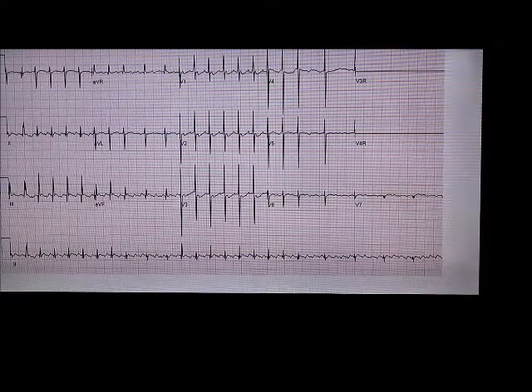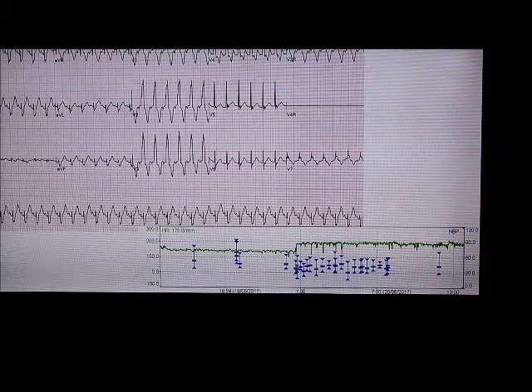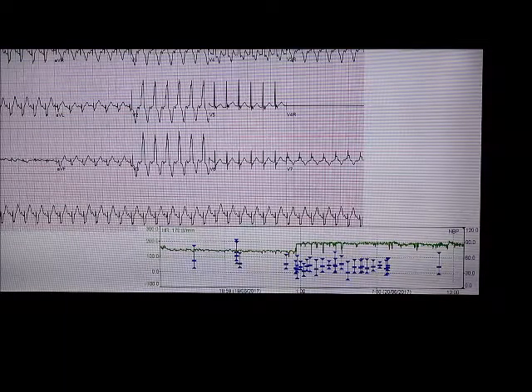Okay. What's the diagnosis in cardiology? So this was atrial tachycardia, ectopic atrial tachycardia. And it was interesting because once we started esmolol, heart rate went down, and aVL became isoelectric. This was the only change that we saw in the ECG. So, yeah.